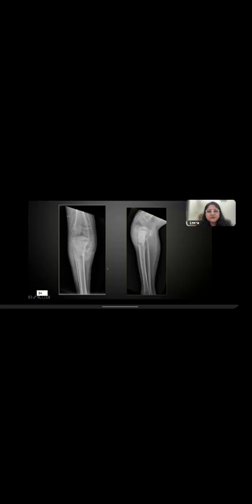34. This should be easy to pick up. This, enough and more of this we have discussed. 34, osteosarcoma. Great. Proximal tibia, and it is eating away almost the proximal fibula, and the lesion is causing Codman's type of periosteal reaction. There is cortical destruction, interrupted type of periosteal reaction, large soft tissue component, and infiltrative lesion with moth-eaten or permeative appearance and wide zone of transition. Okay.